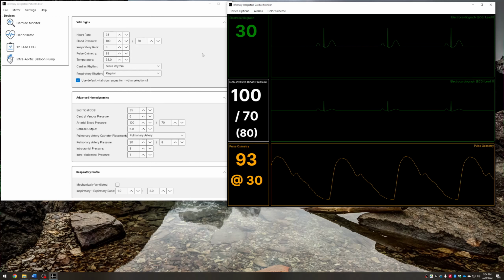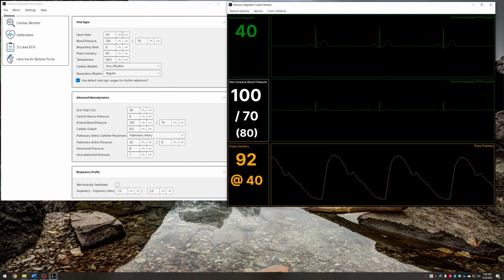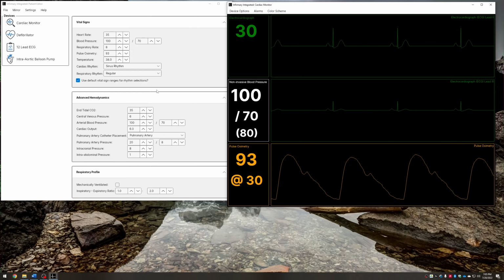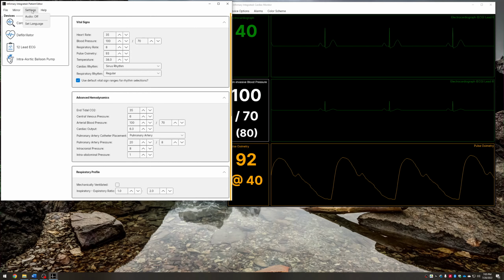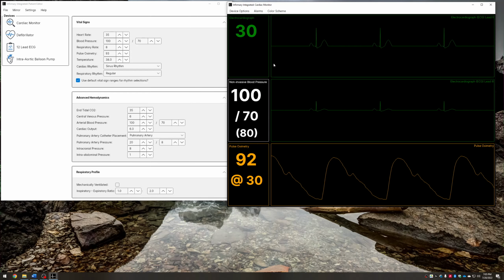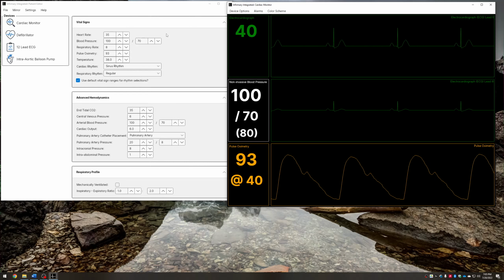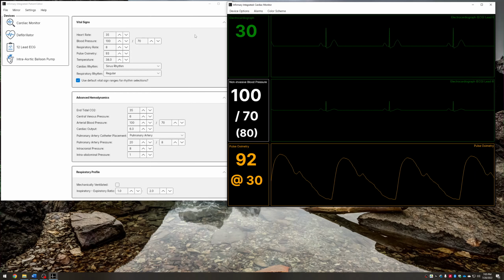We have alarms built into Infirmary Integrated, and so when a patient falls outside the default values for alarms, Infirmary does alarm. The setting for turning audio on and off is actually in the main patient editor. Now that I've turned the audio off, I'm going to re-enable the alarms to show you visually what they look like. What you were hearing was the high priority alarm, similar to the triple beep that a lot of us inpatient nurses are familiar with.